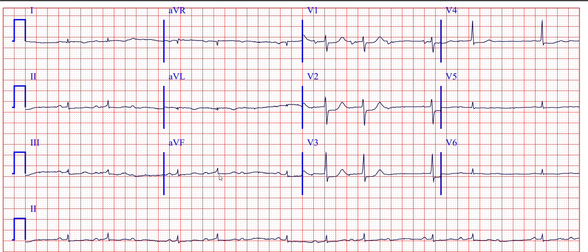carcinoma that was not treated. They denied treatment because it was already stage 4, and after a few years he presented with symptoms of chest pain, and they did an ECG and found this. So when you see an elderly male with chest pain, one of the differential diagnoses that you can think of is myocardial infarction, pulmonary embolism, right?